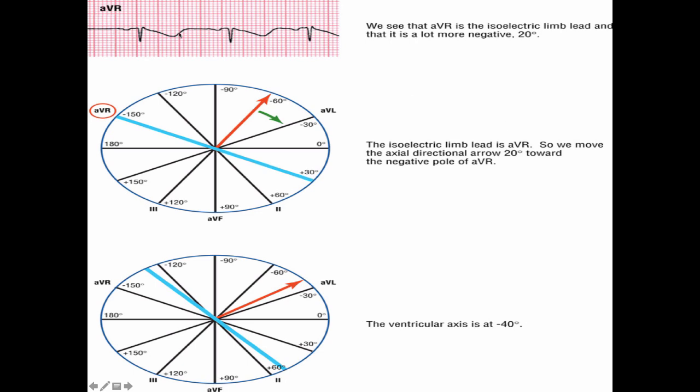We look at AVR, and is that more positive, more negative? It is definitely more negative. It's a lot more negative. It's like all negative. Look at that thing. There's no positivity to it. It's all negative, so we're going to do a negative 20-degree adjustment.